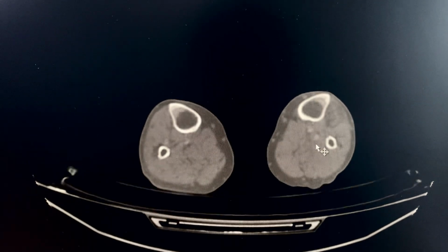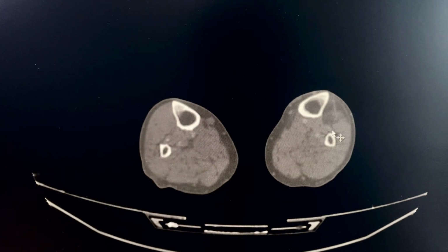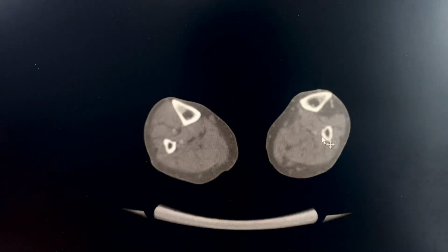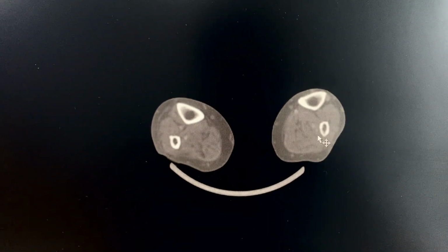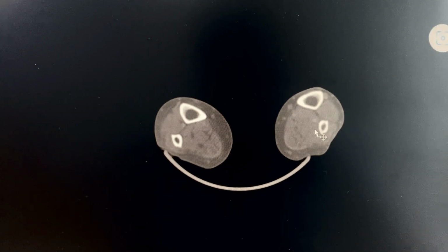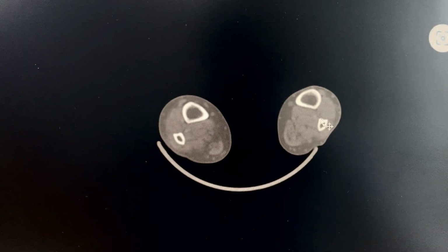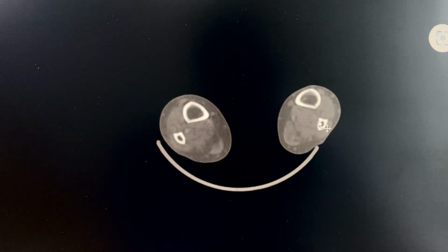The popliteal artery gives off the anterior tibial artery and the tibioperoneal trunk, and then you see here the peroneal artery as well as the posterior. It bifurcates here. The tibioperoneal trunk bifurcates into the posterior tibial and the peroneal artery. The posterior is totally occluded. The peroneal artery remains partly open, partly closed.